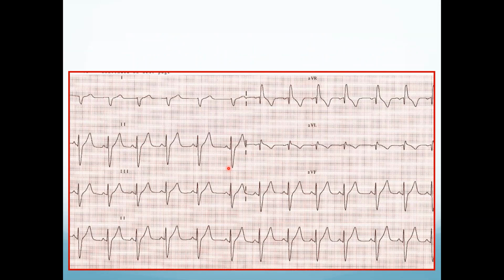So now we're going to move on through some examples of various arrhythmias that we might encounter, and some are going to be malignant, some are not going to be malignant. So this is probably the time to get typing there, and we're going to see this is a 6 leads. So we've got lead 1, lead 2, lead 3, AVR, AVL, AVF, and this is a continuous lead 2 at the bottom. So who wants to venture out and maybe consider what we're looking at? Who wants to be brave and try to make a diagnosis?